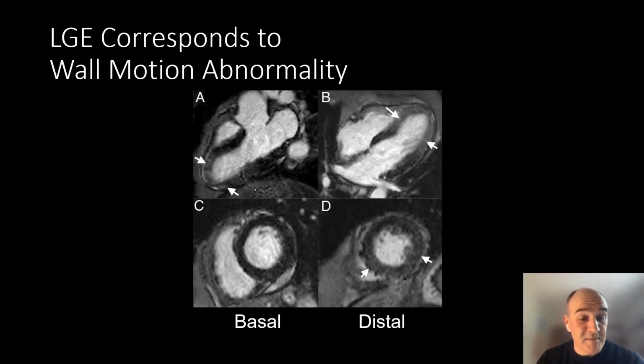And then perhaps even more importantly, late gadolinium enhanced imaging showing that there's no evidence of myocardial infarction, there's no subendocardial scar, but there is a slight haze in the area of wall motion abnormality, and that too corresponds to the edema that's associated with this condition.